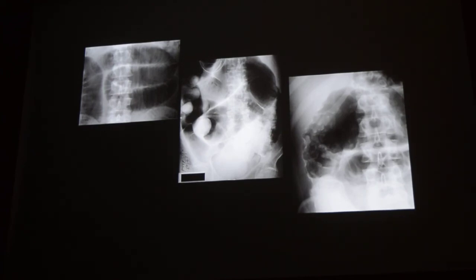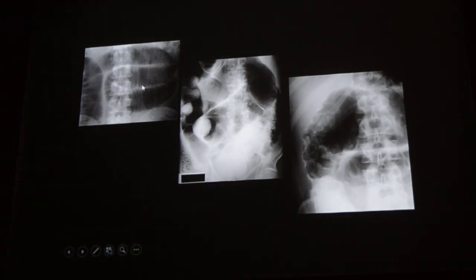How are the folds in the jejunum and in the ileum? More in the jejunum. Okay? So you will have these more folds. If you look at this, these are like a stack of coins lined together. You see? These look like a stack of coins. More folds in the jejunum. And what part is this?